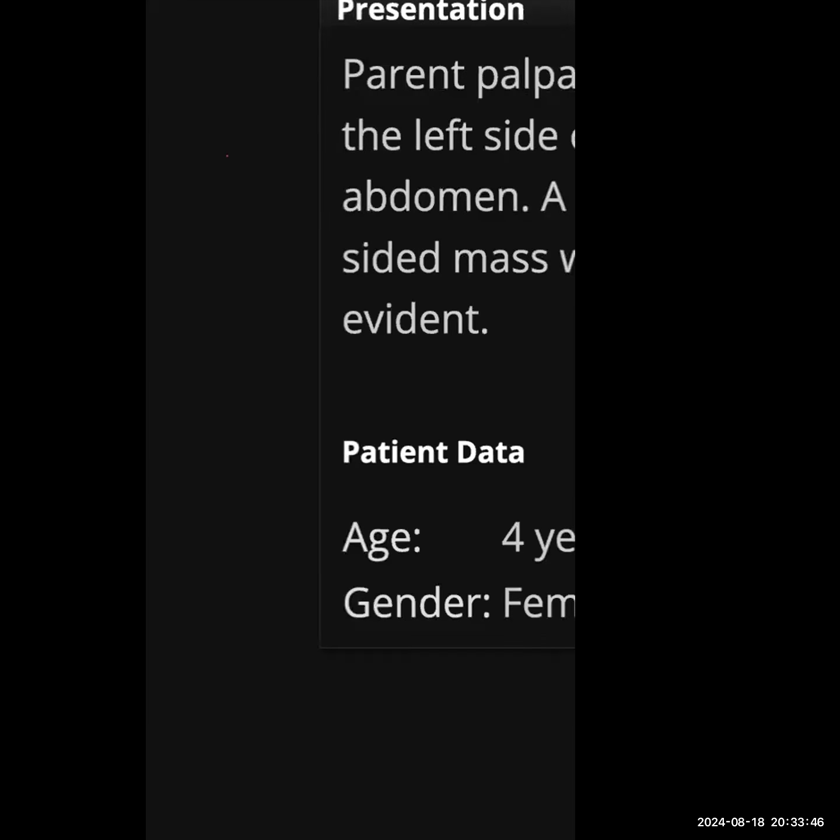You have control. Can you show me where you think the lucency is? Okay. Is there anything else you see? Okay, no problem. We'll just quickly go to the next case. I'm sorry, I have to readjust this. We'll give her an extra 10 seconds in time. So here you go.